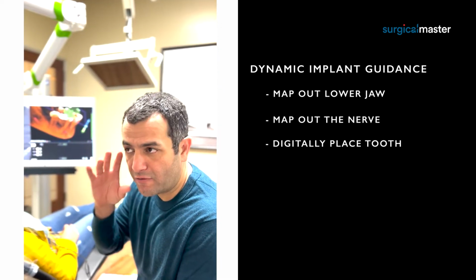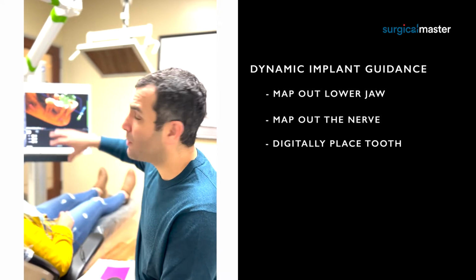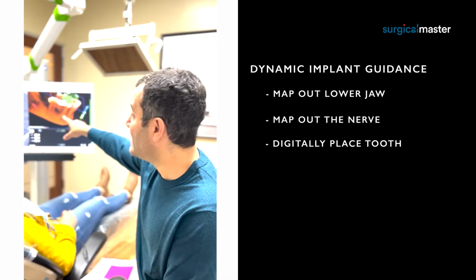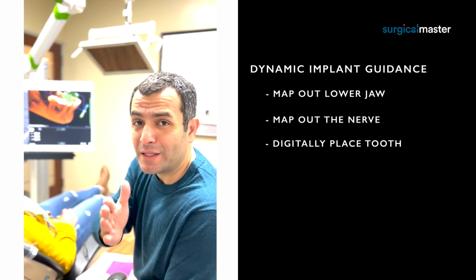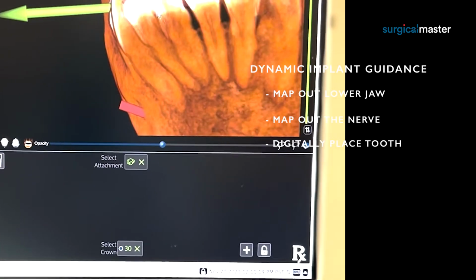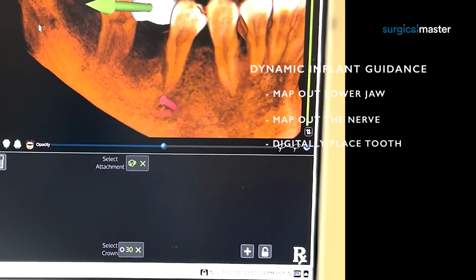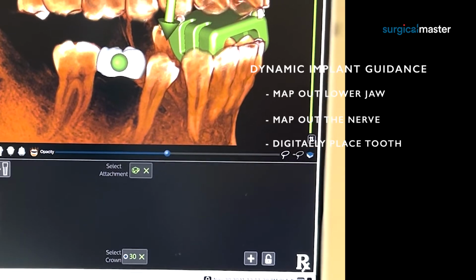You want to have a foresight of 2020, not a hindsight of 2020. So we start where we want the tooth to be. And based on where the tooth is, then we design the perfect placement of the implant. We want it smack in the middle of where that tooth is. You can imagine the level of comfort that a patient gets when they see that their jaw is in 3D and the implant is being designed right there and then in front of them.